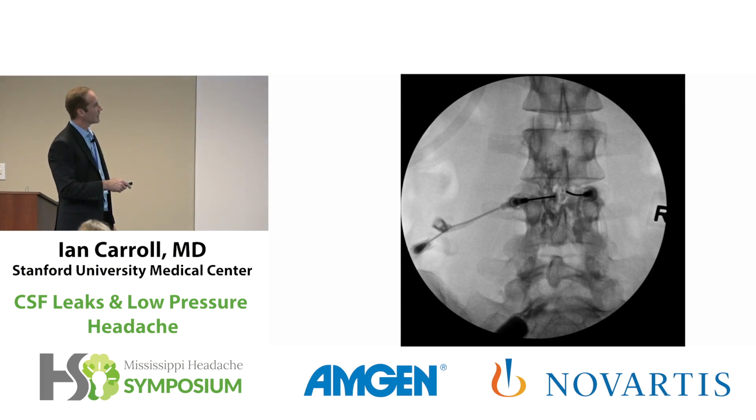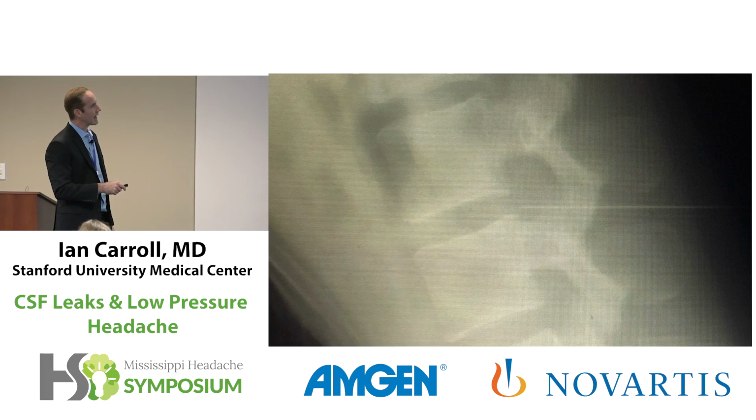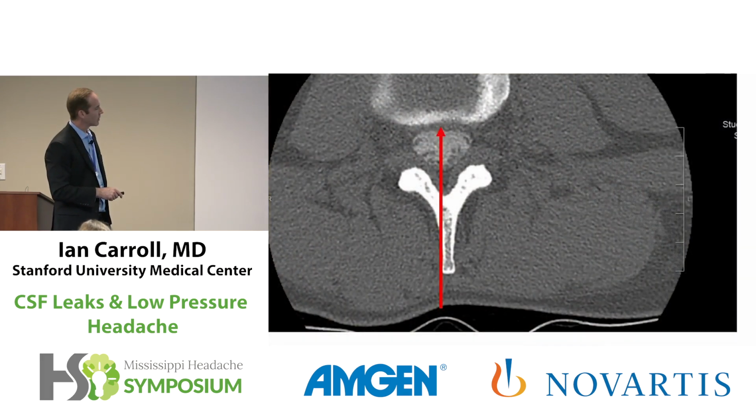Now, one of the things I was worried about is shown here, the lateral view when they did that lumbar puncture for her MS. The dorsal surface of the thecal sac is somewhere back here. The ventral surface, the front surface, is right there. I'm looking at this and I'm thinking there's some decent chance that they actually went through and through to the front surface. And what would be the problem with that? So on a myelogram, imagine they just put their needle through the back surface, where this is where you normally get your hole for a post-dural puncture headache, but they don't realize they're in far enough, they keep going, they go through the front surface. What if you have one of those blebs on the front surface?